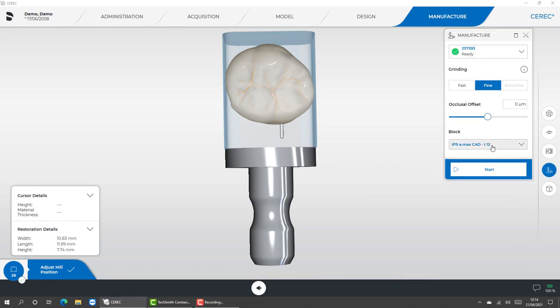I've now actually turned on the CEREC milling unit, and as you can see here, we've chosen an IPS Emax, Ivoclar Emax crown. It's a size 12 that we can change to the block size that we're going to use. And again, you're just going to select the block size that A, fits your restoration, and B, that you have in your drawer. Again, you can see here there's various items that we can play with and adjust, and again we'll talk about those in due course.